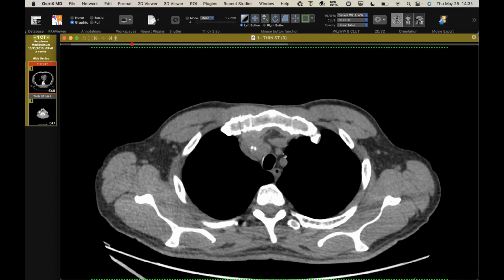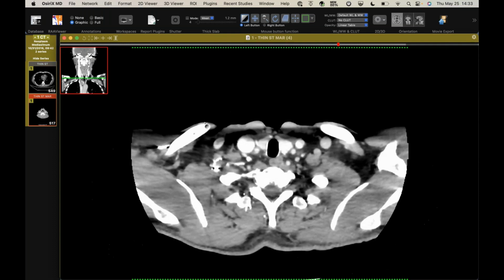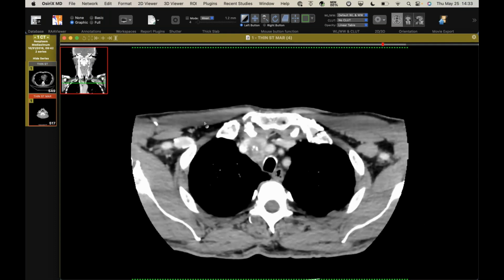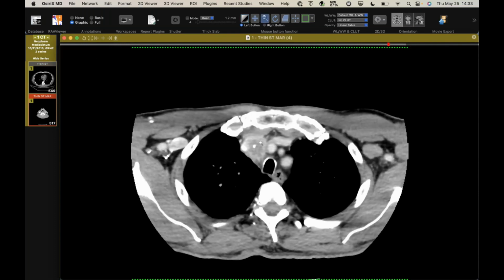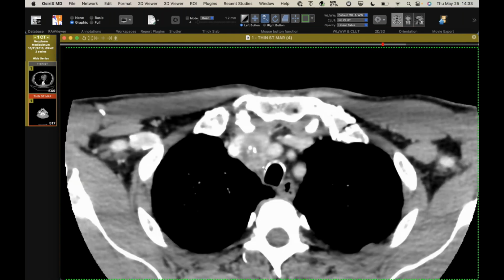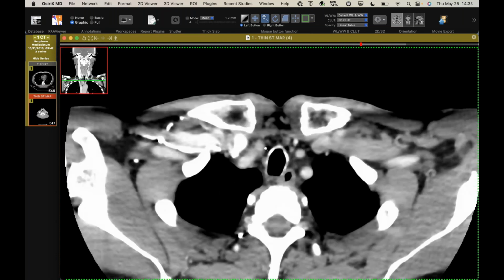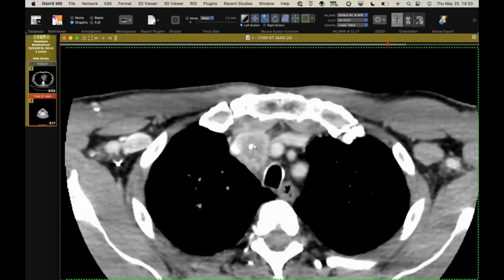Oh, geez. And I can't connect this to the thyroid. I'll show the neck again. Really? I think this is ectopic thyroid tissue that developed the cancer. Wow. Because I think this looks like typical hypervascular thyroid tissue, like we see here. Yeah. And this is necrotic. And we see calcifications in little thyroid nodules all the time, but yeah, right.